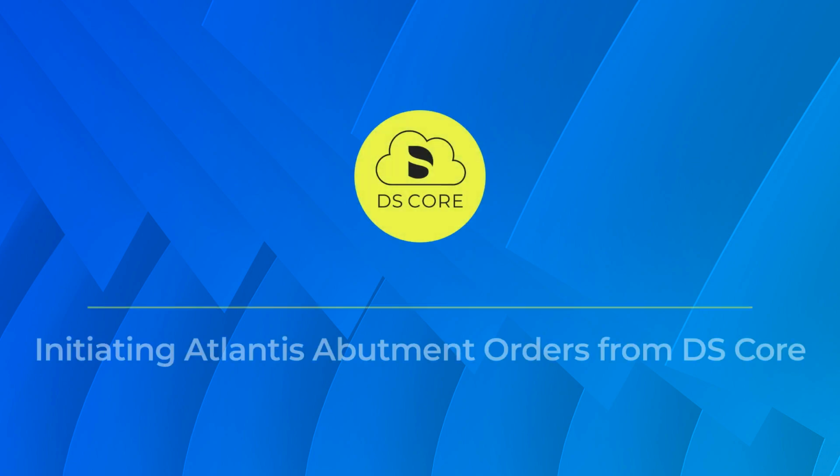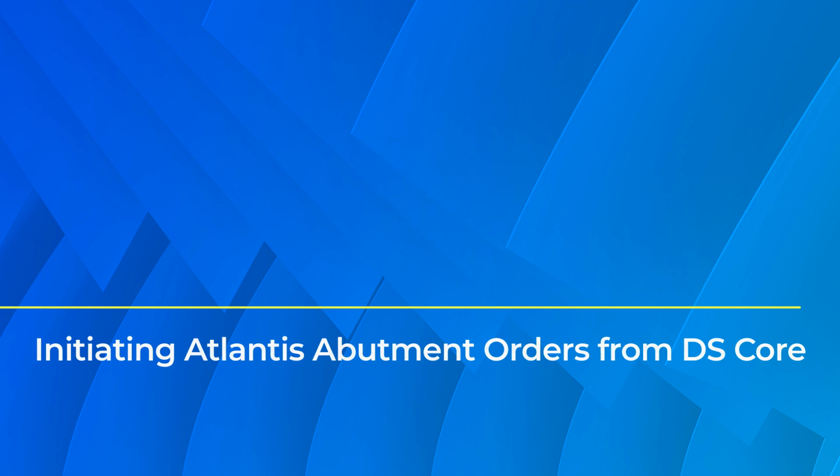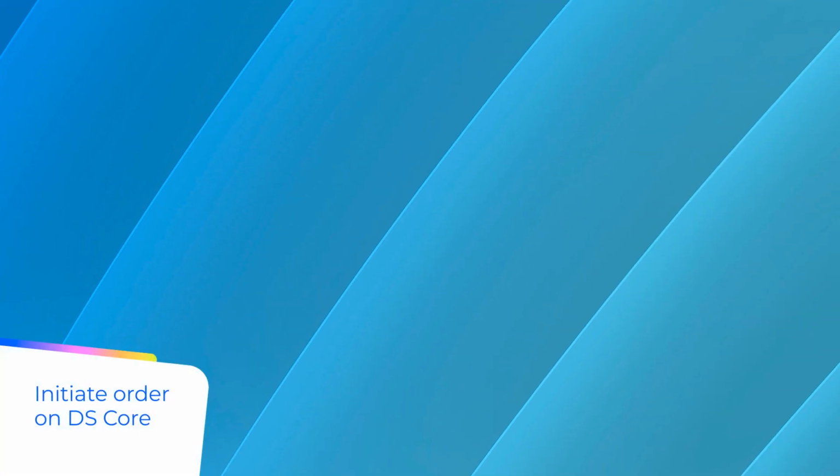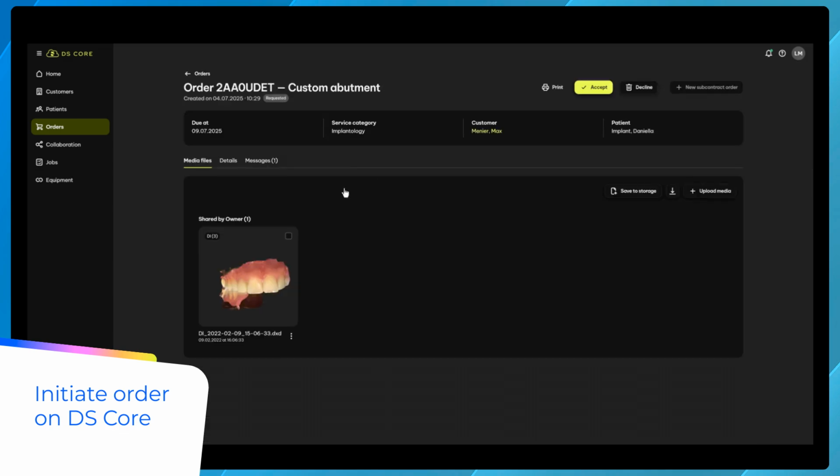The following process describes an order handover from DS Core to Atlantis Web, for an order that requires steps in both platforms, which is available for both clinicians and dental lab accounts. Let's begin. A customer has sent an implant case, including an Atlantis Abutment and Core file request.